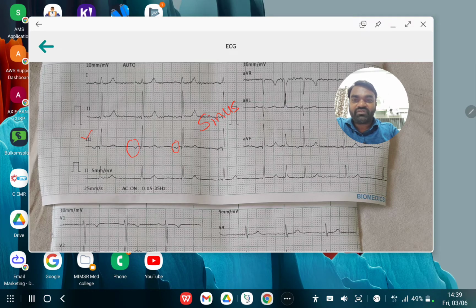If you look at the P wave in lead 1, you are finding it positive. Fine. So this is one of the observations over here, and another very important observation. If you see the interval between the RR complex, you always have to look at lead 2, and it is called a rhythm strip. Whenever ECG is being recorded, you have all other leads above, but lead 2 will be a long lead.